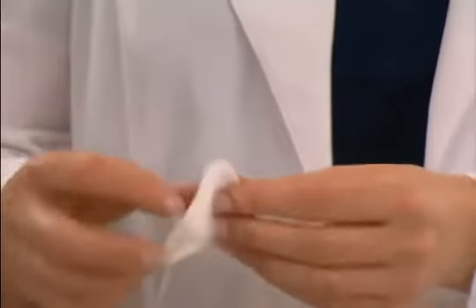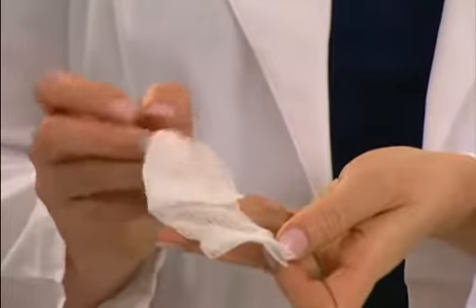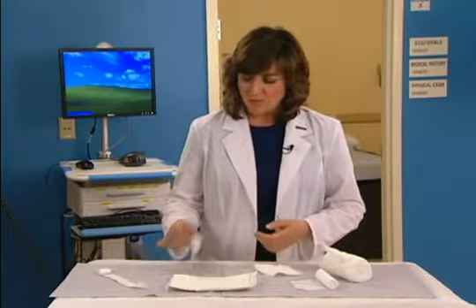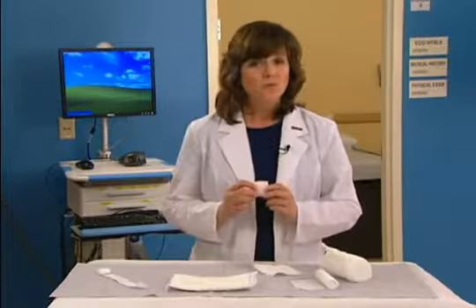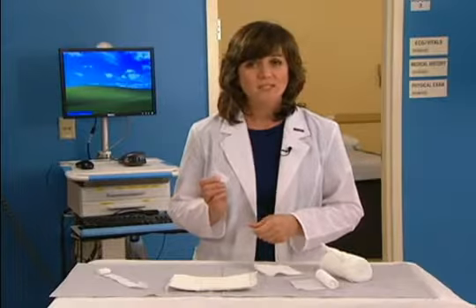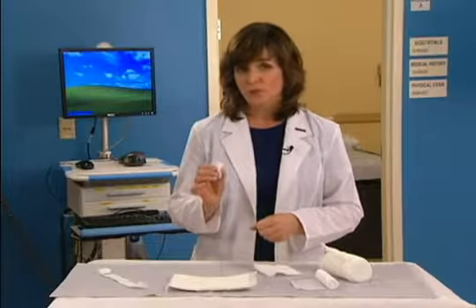Woven gauzes are manufactured from cotton yarn or threads and woven like fabric. Non-woven gauzes are usually manufactured from synthetic fibers, which are pressed together to give the appearance of a woven fabric. Gauze may be used as a primary or secondary wound dressing. Gauze remains popular largely because of its cost-effectiveness in one-time or short-term use.